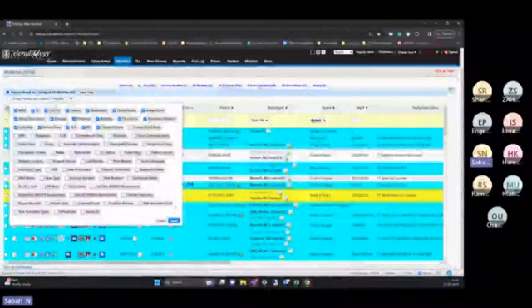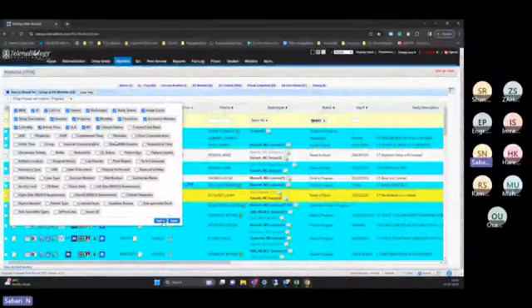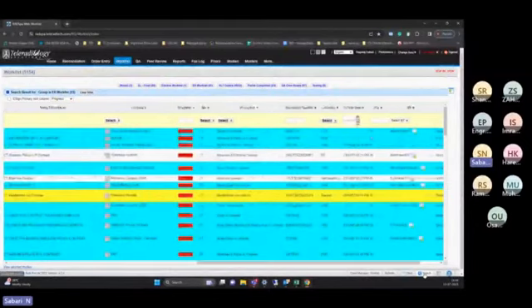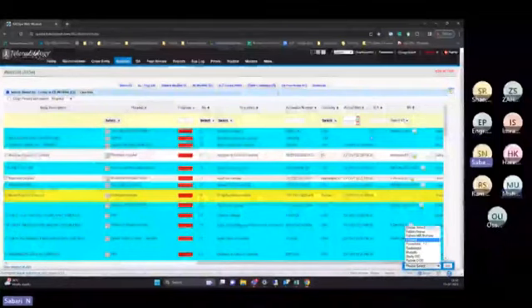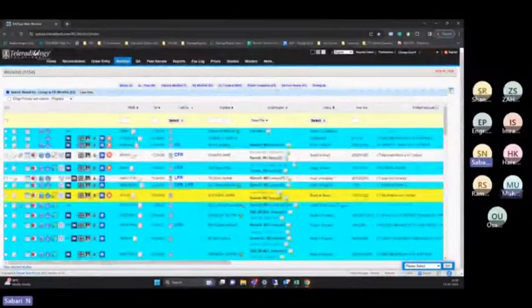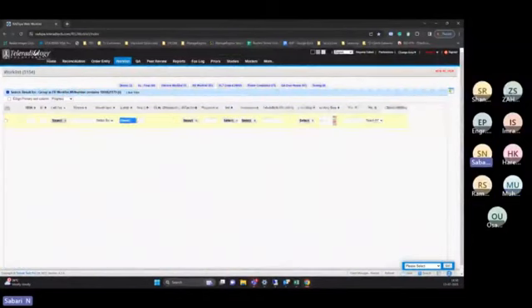So here we can see there are n number of options where we can select or deselect all those things, whether you require them or not to be recorded. So that's all from the work list part. And here we can see there is one option called search. So this is called a global search. Okay. So here also you have a search everywhere in the screen. You can see MRN. If I want to search a particular patient, if I put a medical record number and search, the particular scan will get displayed only from the work list.